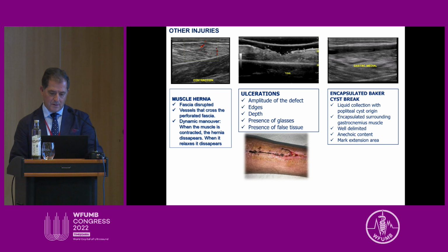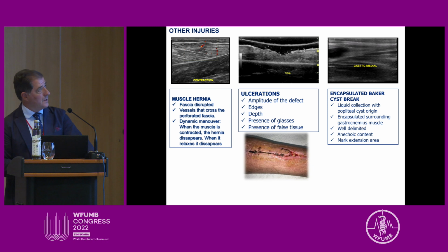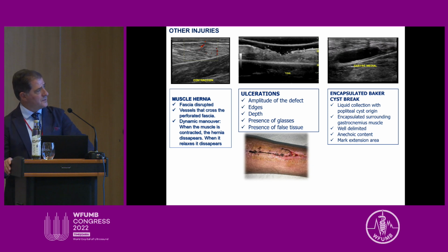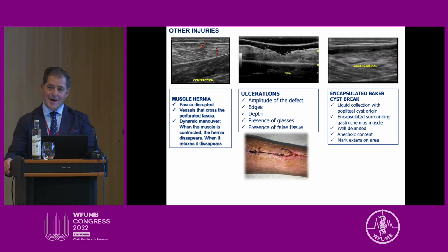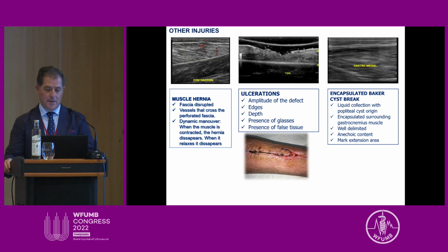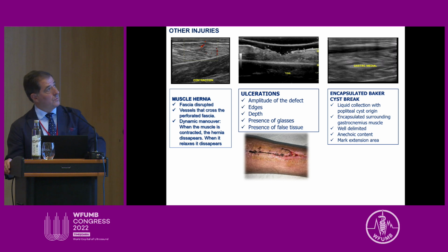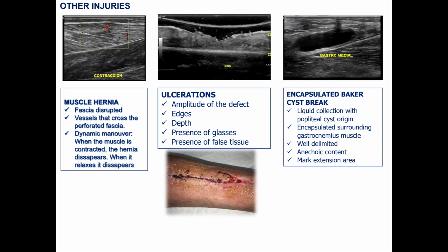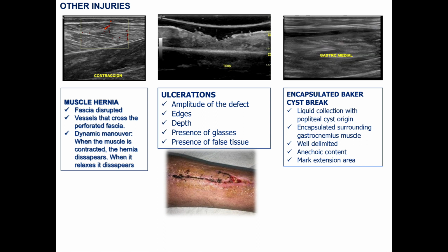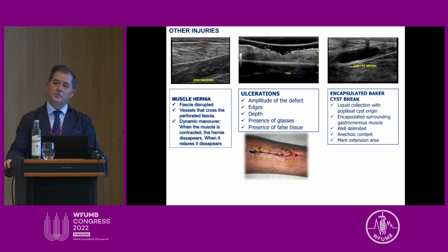In this case, in the video, we see the Baker cyst break, but encapsulated some weeks after the rupture. And the patient keeps the pain. You find this image. Normally, you can think about trauma or about a Morel-Lavallée effusion.